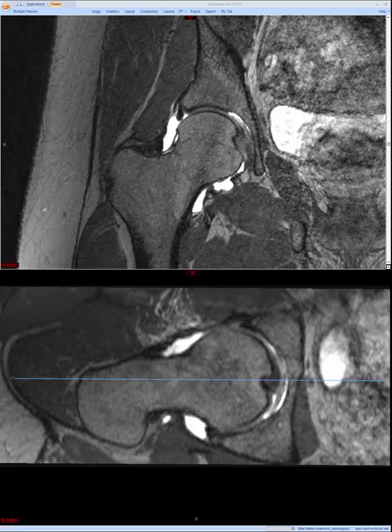And so having looked at all that, then I look at the regional tendon attachments, and we'll go over all of those, particularly since it tends to come up on OSCEs a lot. And then the regional musculature, look at the marrow signal, and then we start looking at the corners of the film, like the right SI joint. Sometimes you get just a little bit of the SI joint, and then usually you guys tell me if there's something going on in the adnexal regions or pelvis that warrants further investigation.